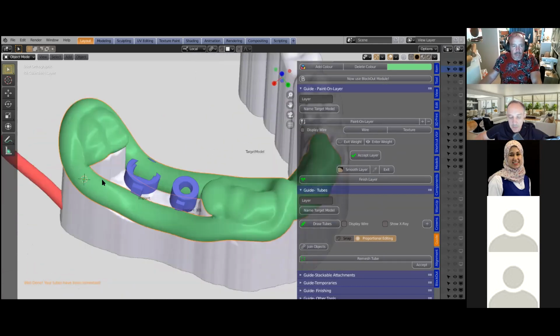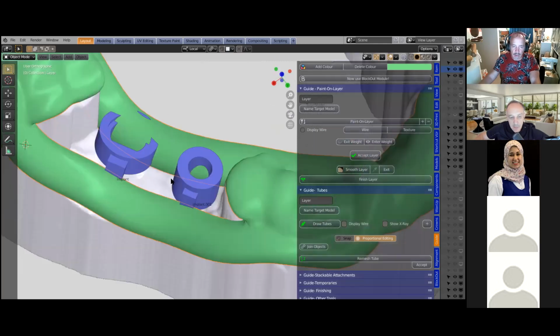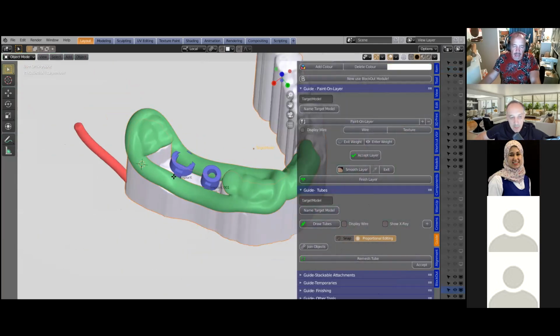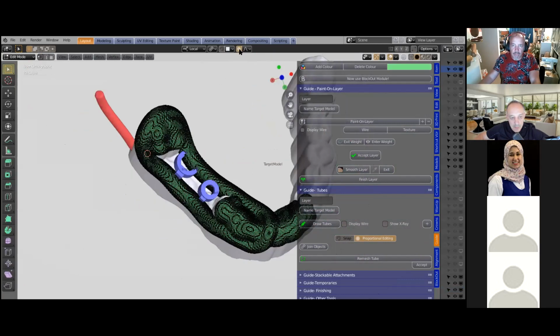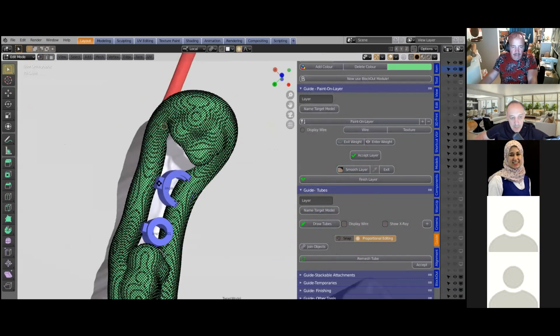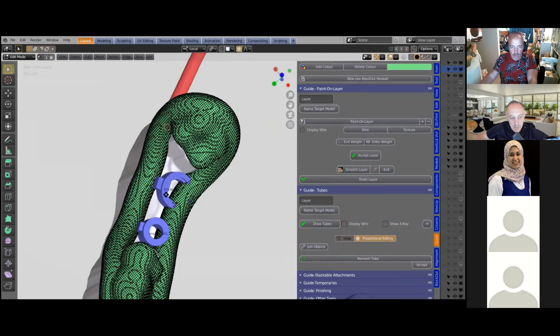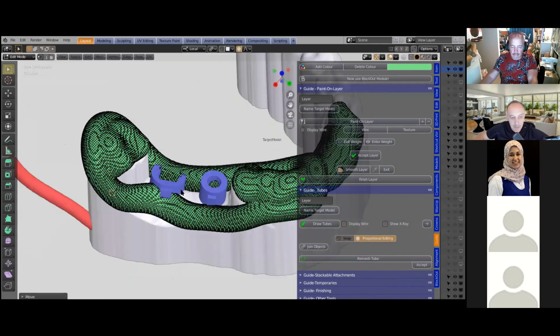Here we could have come a little bit closer. I'm thinking, what do I do now? So I'm going to go into edit mode. I'm going to click here and make sure the proportional editing is on. Use the G key, and with the mouse wheel, just pull it across. Just put it in there like that. That's all good. Tab. Okay, perfect.